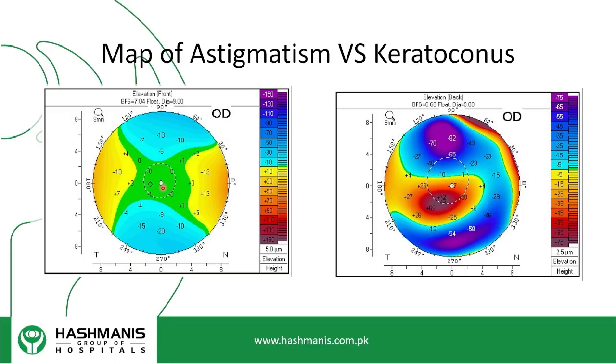Now, when you look at the elevation data for a keratoconus person, the steep and flat axis don't matter. You're actually seeing a center exaggeration of the thinnest point. That is the keratoconus cone that you're seeing. And if you actually map this out in OCT, you can see that the cornea is becoming asymmetric, and you can see that it's drooping downwards to the inferior temporal, usually to the inferior temporal.